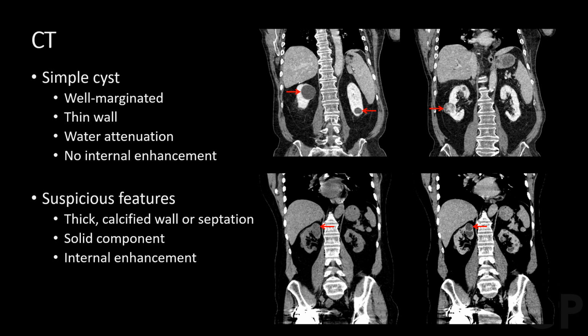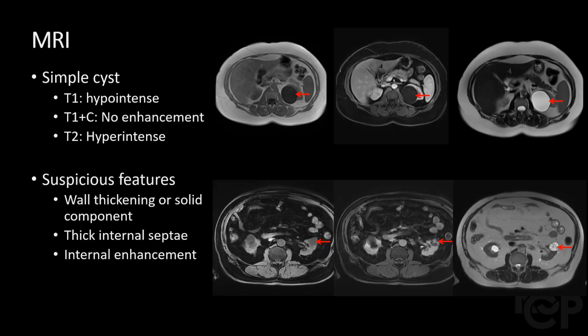The bottom images are pre- and post-contrast. The pre-contrast is on the left and post-contrast is on the right. The cystic lesion in the upper right kidney demonstrates an area of enhancement along its medial margin on the post-contrast sequence, which is suspicious for renal neoplasm.